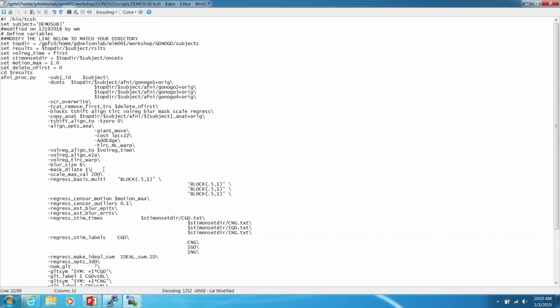What they found in various iterations of AFNI is that when you're comparing all of the subjects together, you end up taking out a lot of the information you don't want anyway, and masking can introduce some weird artifacts. So we generate the masks, so we have that option, but the only thing we end up really masking in our data is really large spikes way outside of the brain in our image.